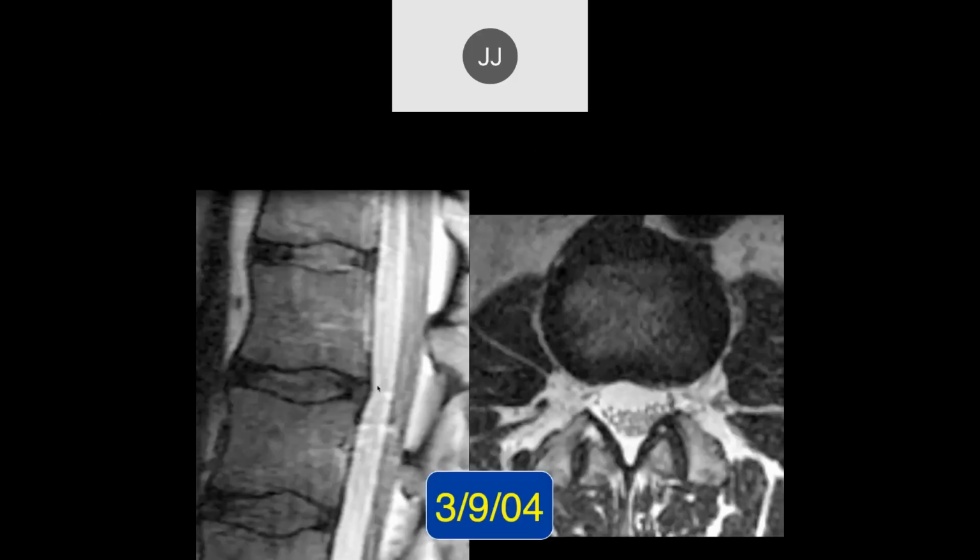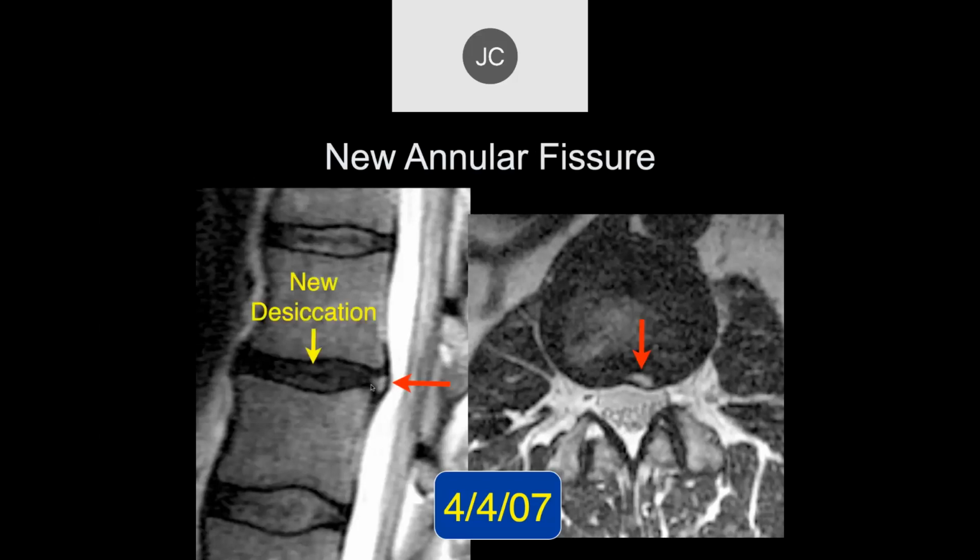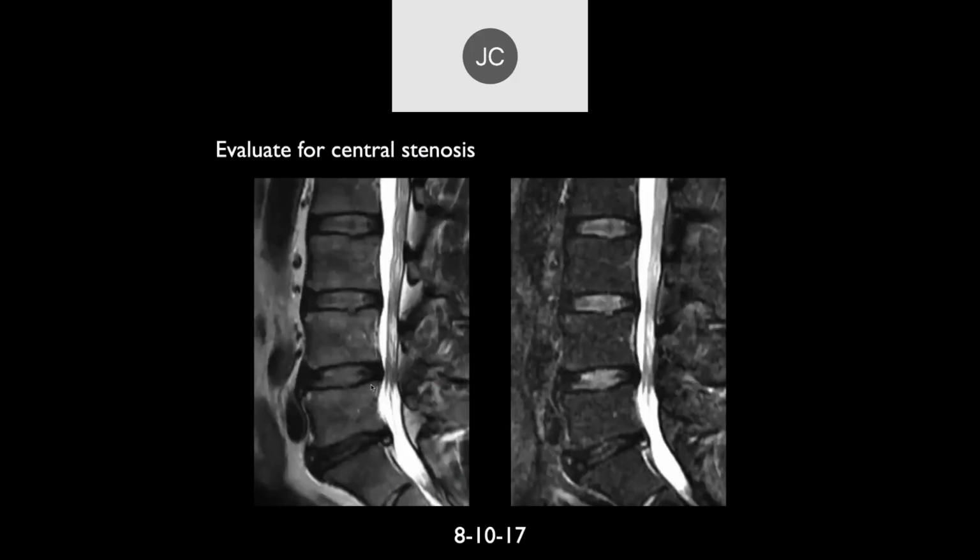This is strictly the annulus fibrosus. Right. And histologically, the nucleus pulposus is really completely dehydrated here. Histologically, in this particular setting, I'm sure this is going to be granulation tissue, vascularized granulation tissue. Okay, Robert.